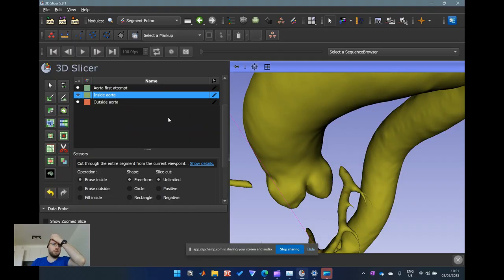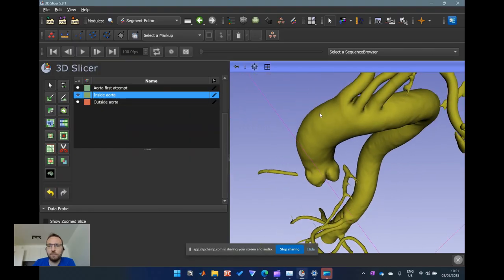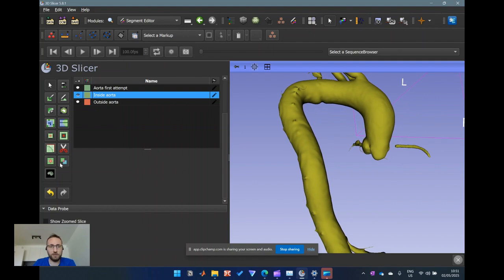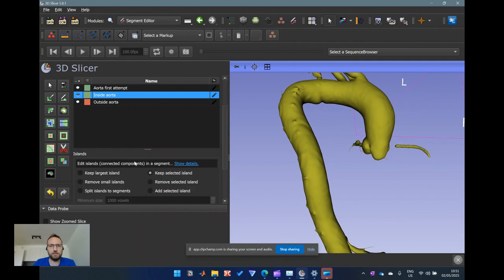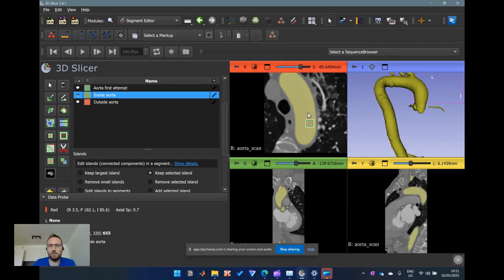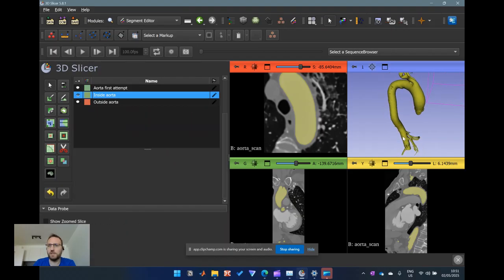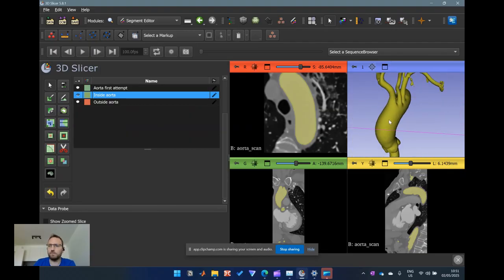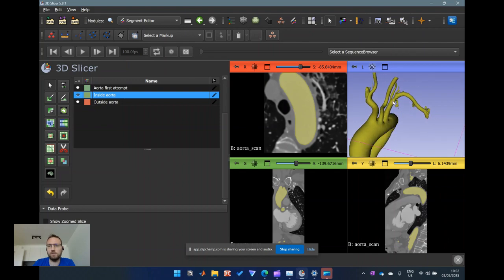And when you remove something, you don't actually need to completely eliminate everything. You just need to cut the connection. And then with the islands, you can select to keep the island and this will remove them. So make sure that you only cut the connections, and like that you see that we preserve the smoothness. And if one continues like this, you can get a nice result, or a result the way that you want it.